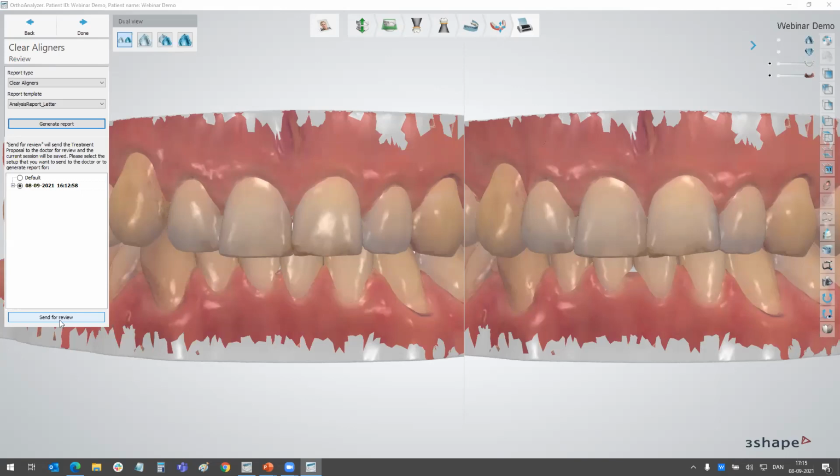So only 15% is allocated, and the funny thing is that unless you're working on a laptop where there are few cores, so if you have a normal desktop PC with a powerful graphics card, then it takes comparable time to if you export it in the foreground, because the developers have made a lot of cool refactoring around this topic. So you can expect the same export times, which sounds a little bit contradictory, but it is in fact the case. But now you just don't have to wait for it at all, because it will be done in the background and you can start doing other work on a different case in the meantime.